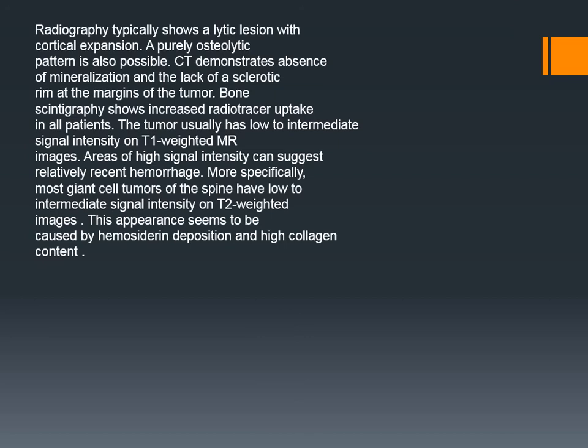Radiography typically shows a lytic lesion with cortical expansion. A purely osteolytic pattern is also possible. CT demonstrates absence of mineralization and lack of sclerotic rim at the margins of the tumor. Bone scintigraphy shows increased radiotracer uptake in all patients.